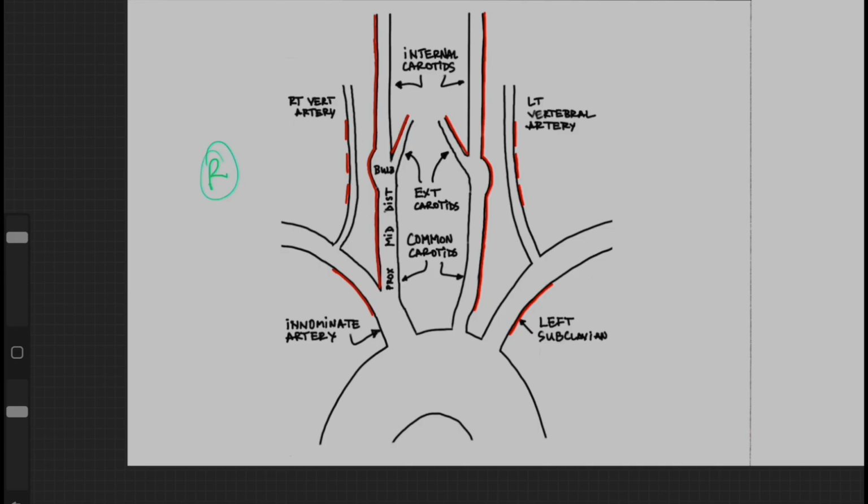And we'll just go through the study sequence here. Things start on the right in vascular land, so the tech will image the proximal, mid, distal common carotid and the bulb, and then go back and put color on each of these segments and then do a pulse wave of each of those. Then they'll demonstrate the external carotid artery, then do a color of it and a pulse wave, then they'll do the internal carotid, do a color and a spectral Doppler of the segment.